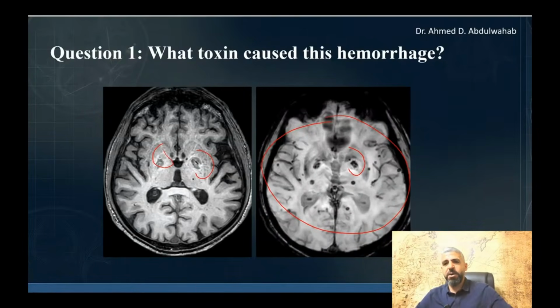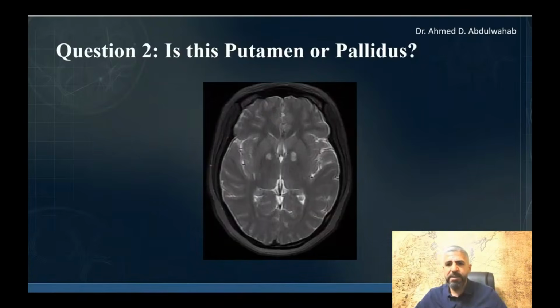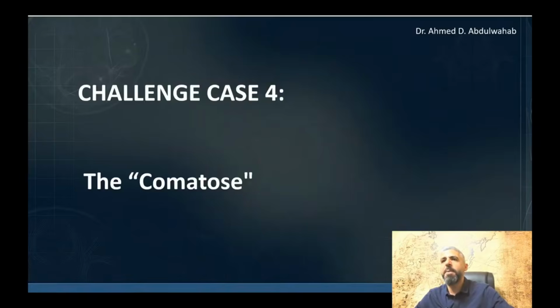This is, of course, for everyone who attended all the episodes, carbon monoxide poisoning. Symmetrical pallidal hemorrhage is CO until proven otherwise. Never, never, ever forget this fingerprint. Question number 2. Is this putamen or pallidus? Let's go to challenge case number 4.